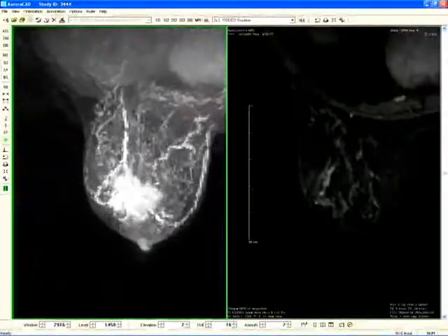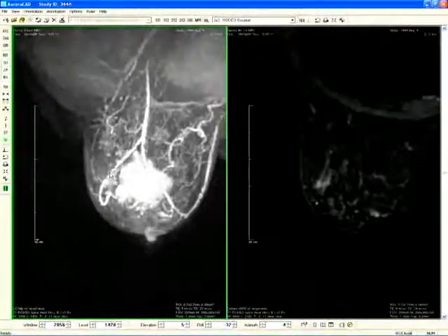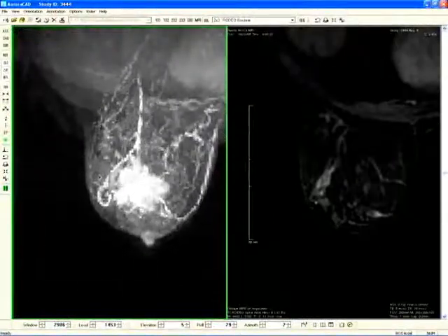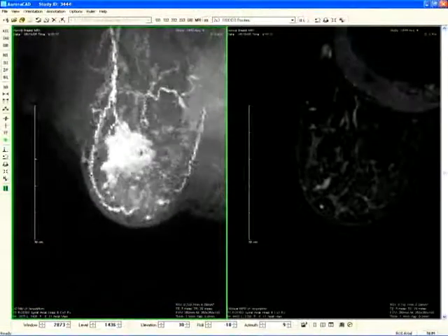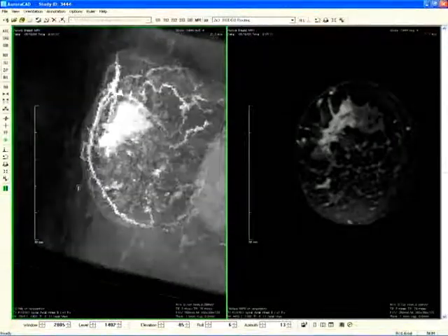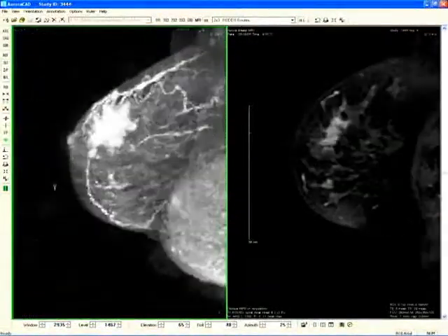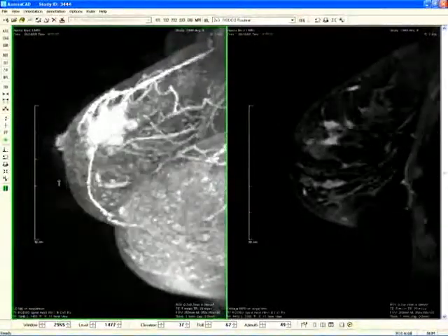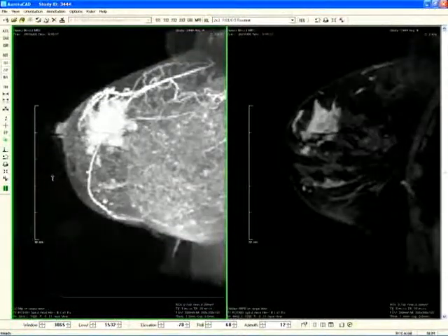The breast is not organized in orthogonal planes, sagittal, axial, and coronal. Fortunately, with spiral RODEO, you do not need to pick your viewing plane when you scan. A high-resolution image can be calculated interactively on AuroraCAD to match the best plane for the lesion. This double oblique slice shows the branching clumped enhancement pattern typical of DCIS.